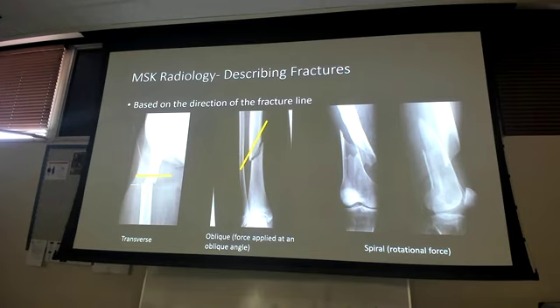You said you were going to talk over this one about how it's shot, like how you know this is a right. Yeah. So anything besides that one? Okay. Now again, that's going to go back to what I just said. How do I know it's a right? Well, this is an AP hip x-ray, or really the upper part of the femur. And when I'm looking at it, I have to use this because my screen is broken, so I can't draw on it.